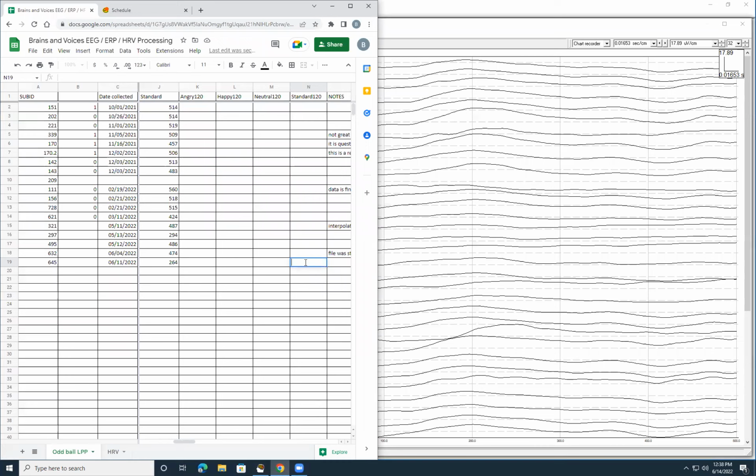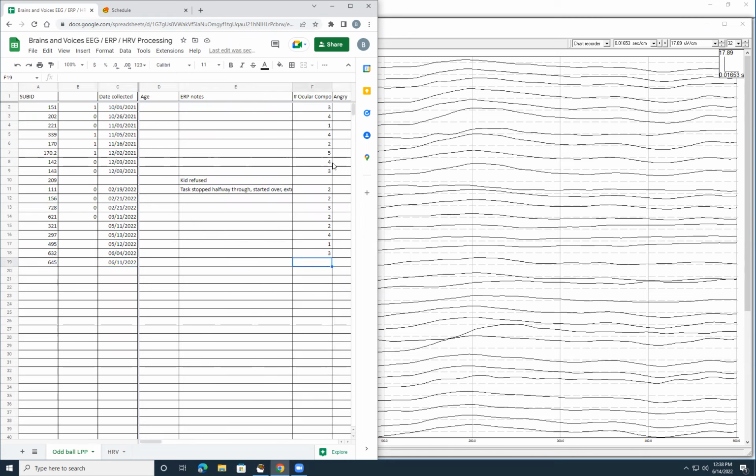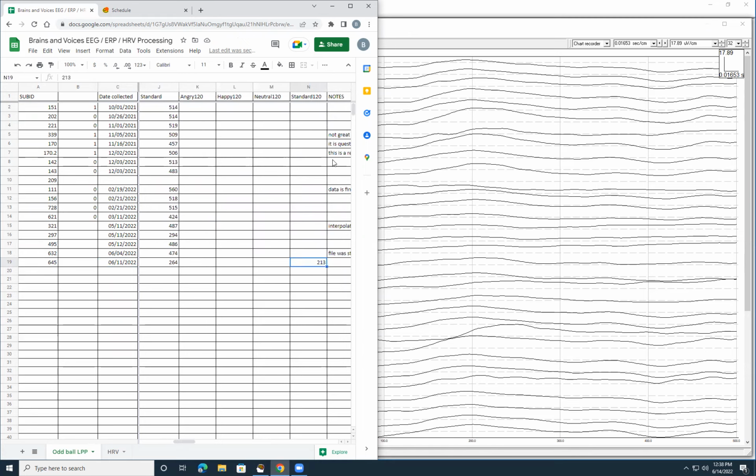Pretty big difference. So I'm going to go back in and we're going to fill in the rest of the chart for not just this person, but for everybody else to make sure that it's really clear that we've got two different options for the event pipeline. And that should make that clear. Thanks very much.